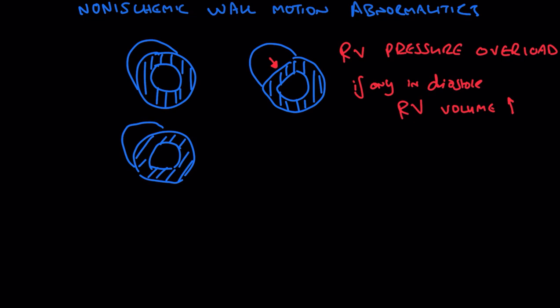Well, again, I want you to think about what could be pressing up from here, and any kind of abdominal disease process where there's increased pressure. You can see it in pregnancy if someone has significant ascites or something else where there's a buildup in abdominal pressure. That can cause this inferior wall deformation of the left ventricle that you might initially confuse for ischemia. But again, it'll typically be more pronounced in diastole when pressures are lower.